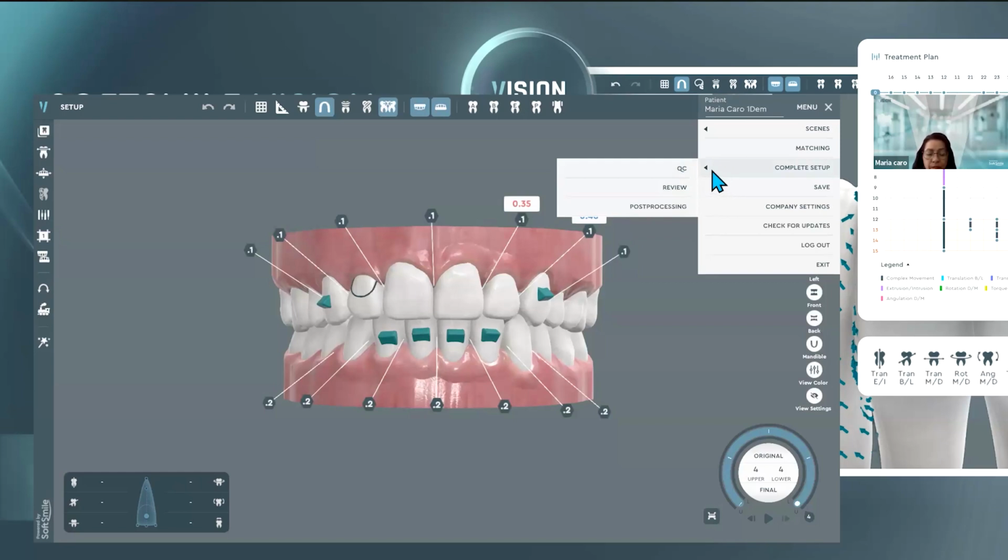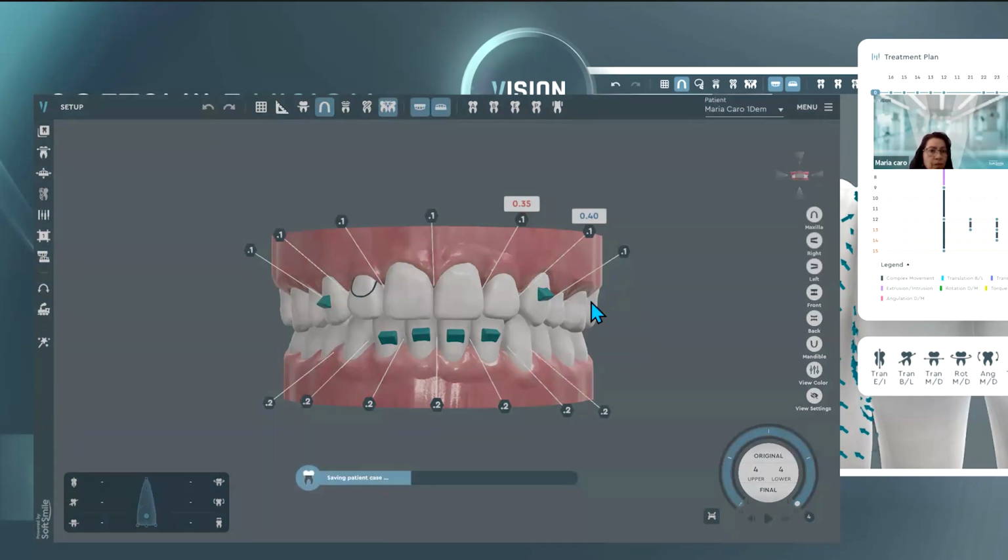You can skip it if you decide that that's something that you want to do and maybe you don't need your client to review it. So again, if there's an internal process that you would like to set up for a quality check, you can send the case to QC. And so that's what we're going to do now. I'm going to send this case to QC. And so it'll undergo the process.